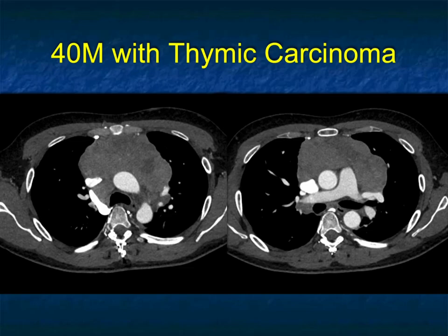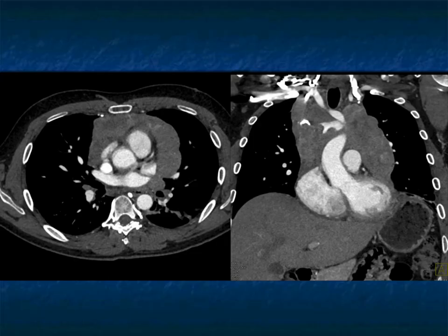Another case, large anterior mediastinal mass. This could be an aggressive thymoma. Also, lymphoma, big bulky anterior mediastinal mass. There's paratracheal nodes. There's some right hilar disease. So we talk about differentiating lymphoma sometimes from thymic disease, particularly thymic cancer, can be very difficult. Again, you see it's growing down. It's involving the pericardium.